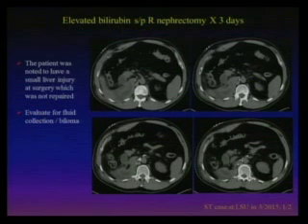Yeah, I mean, there's a fluid collection throughout that whole area. Okay. So can you tell what this contains? What is this? So give me a differential. Is there air in there? No, no. This is suspicious for bile leak. Can you rule out a bile leak? It could be. Could be a bile leak, right? Could be a biloma. What do you want to do to say yes or no? Confirm that. Do a HIDA study.